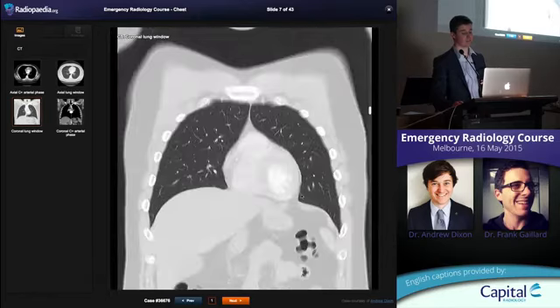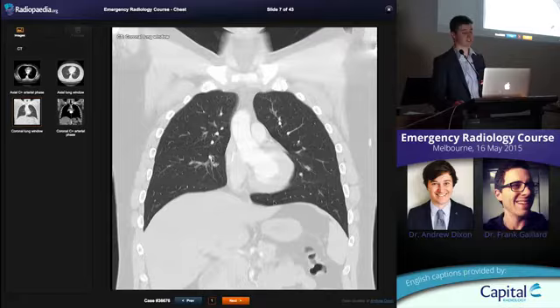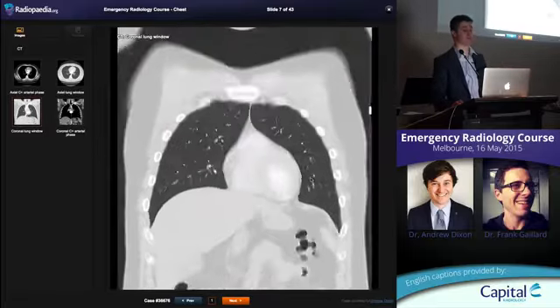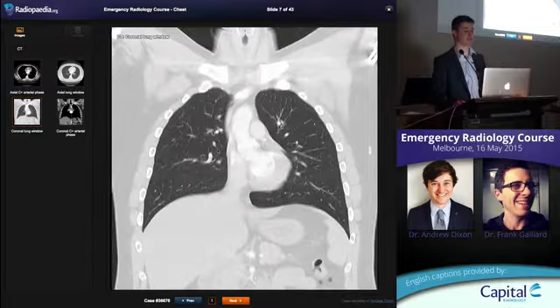Lower lobe is not really touching the heart. So it's sitting right at the base of the heart, okay, but it's touching the hemidiaphragm, okay? So if you have consolidation in the left lower lobe, you're going to lose that left hemidiaphragm ability to differentiate it on your plain film. Okay? If you have consolidation in the left upper lobe lingula, you're going to lose the ability to see that left heart border.